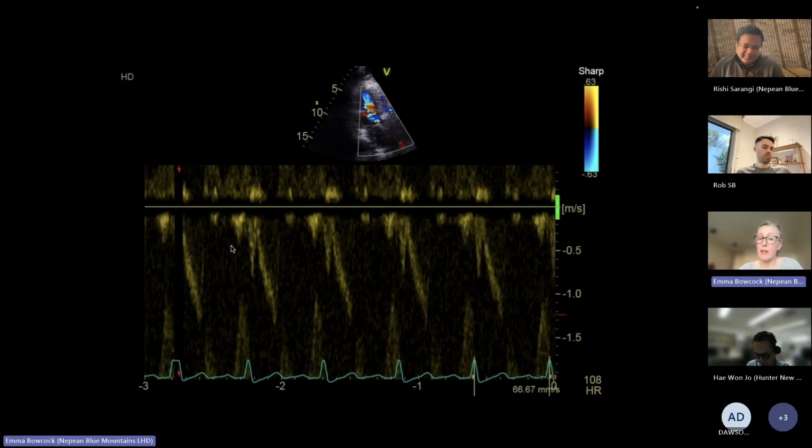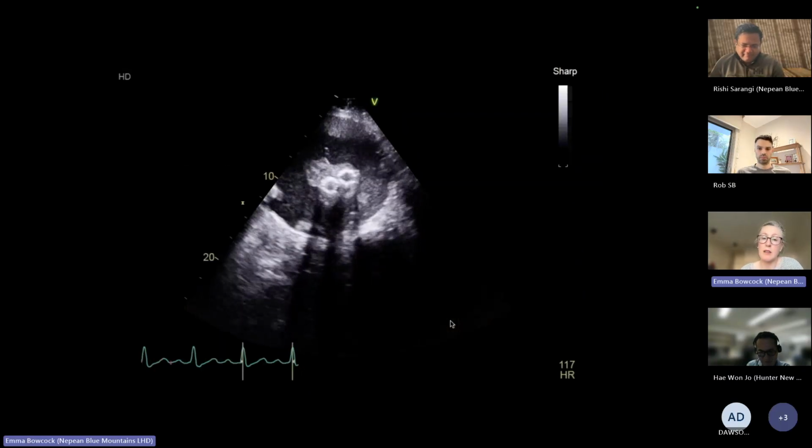They could just show you this one image and say, tell me what's happening, explain the physics. So it's all about timing, right? Whenever you're asked about Doppler, always think, is it in systole or is it in diastole? Then you can figure out, am I using pulse or continuous? And is the flow actually in systole or diastole? Then you can figure it out logically, because if you looked above the baseline, you'd be able to figure out that that's just the aliasing of the E and the A because of that range ambiguity.